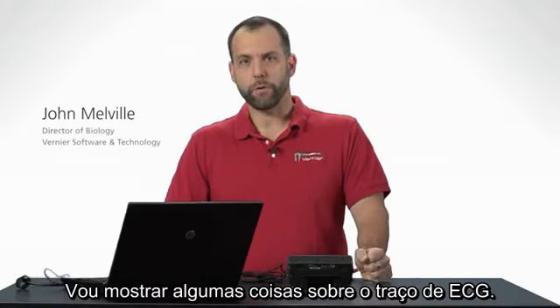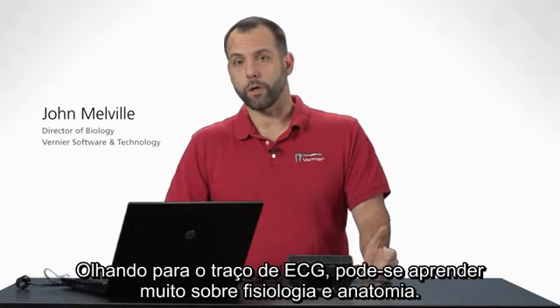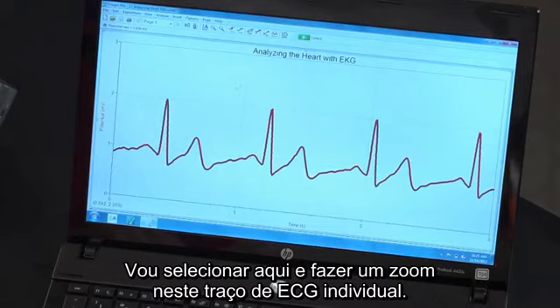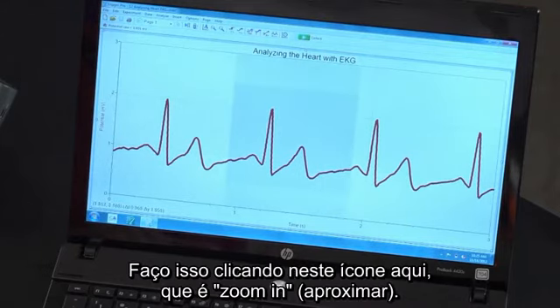So let me just show you a few things about this EKG trace. Because in looking at an EKG trace, you can learn a lot about physiology and anatomy. So I'm going to go over here. I'm going to zoom in on this single EKG trace right here. And I do that by hitting this icon right here, which is zoom in.